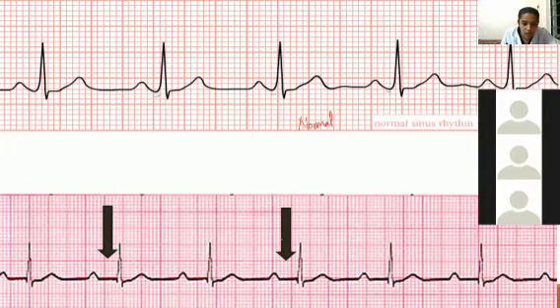But here you can see a delay is also there. After the P wave, a prolonged delay is more here. But this delay is consistent in all the leads. And anyway, the conduction is happening and no other abnormalities are present, so the patient will be asymptomatic. You can compare it with both so that you can identify this one. The gap will be more in first degree AV block. So this is not a serious condition, but as the block progresses, the patient's condition will worsen.